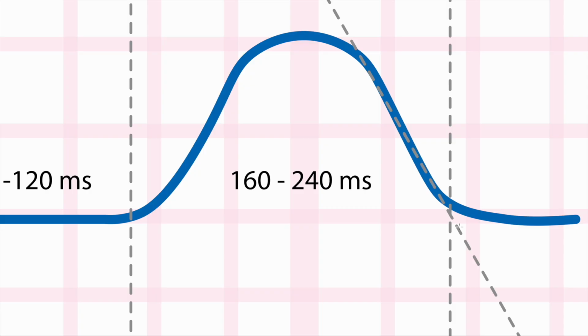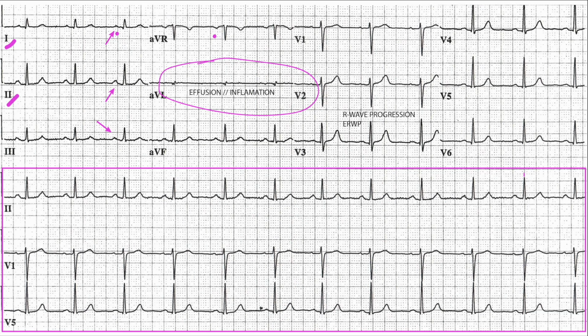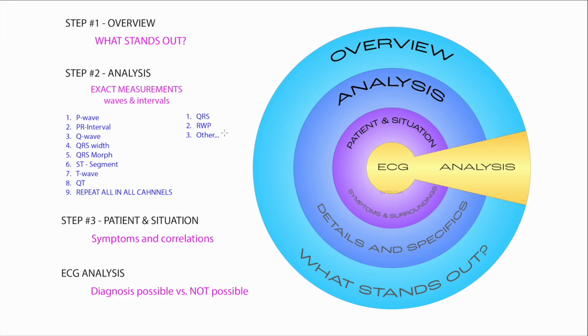And in our lessons, when we talk about what's going on in the T wave, what's going on in the cell, that's apparent. But that's kind of a heavy topic. That's a little bit too much for this. So going back to the ECG, long QT. Do we have long QT? We do not have long QT.